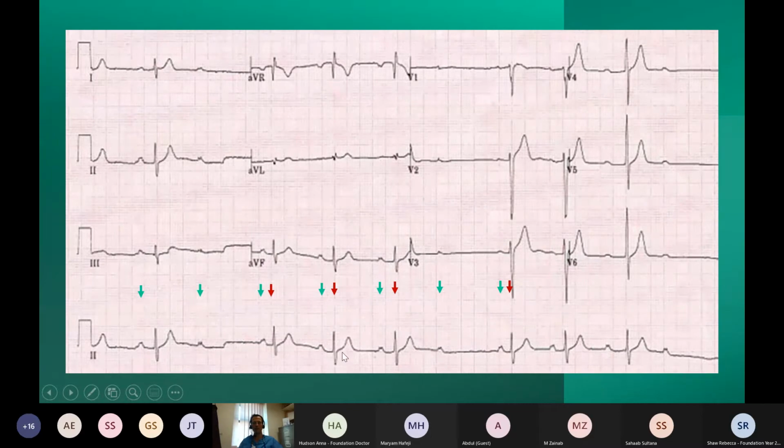And can you then look at the relationship between the P waves and the QRS complex and see how that starts out short, gets fractionally longer again, and then it misses. And then that relationship is reset. So with it marked out, can everybody agree with me that this is Mobitz type 1 heart block? So this is Wenckebach or Mobitz type 1. And this, in all your exam questions, doesn't need a pacemaker.